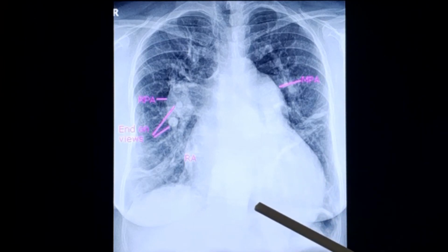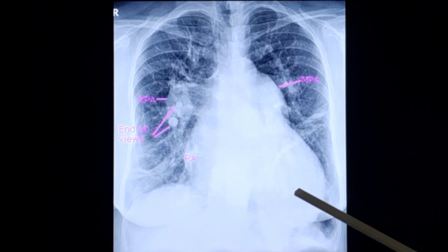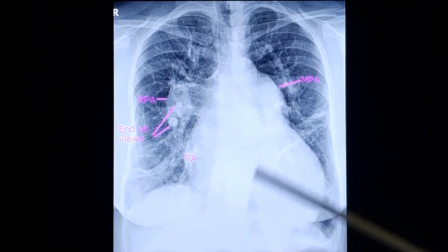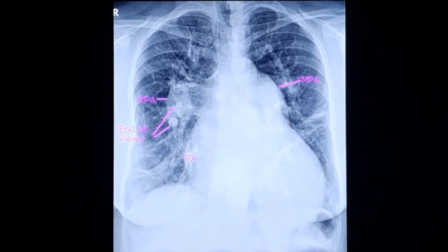And there are some even who say that severe pulmonary hypertension and reversal, all those things, are probably a manifestation of the likelihood of an element of primary pulmonary hypertension in ASD, but that's all hypothesis. Practically, we would think that when you see these end-on views, the pre-existing large left to right shunt is the cause for reactive severe pulmonary hypertension in ASD.